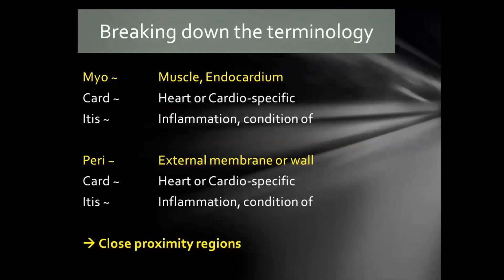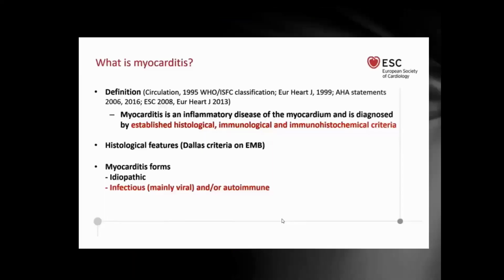And just note that when you're looking at these patients, these are areas of very close proximity. So you do have to differentiate a lot of different things, which mostly will be done by the attending. But you always want to be knowledgeable as a sonographer to be sure that you're showing all the substrates of the myocardium through outside the pericardium and, of course, into any effusive area.